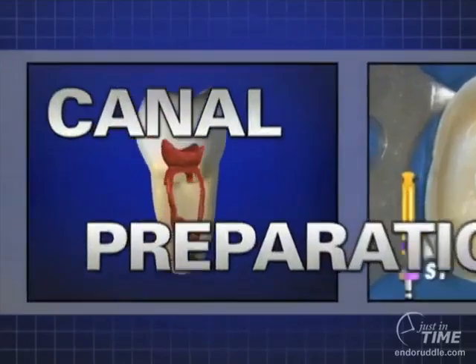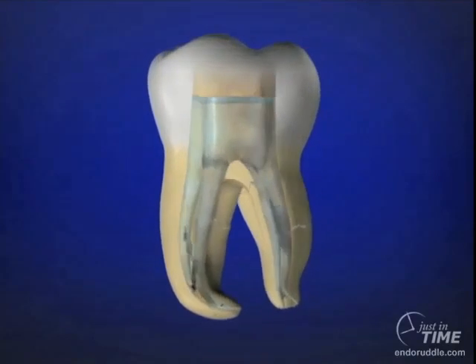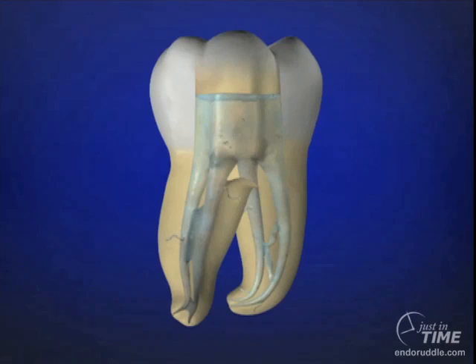But when you think about the micro CT work that we see in various textbooks and online around the world, some of these systems are very complicated and formidable. Our job is always the same, a complete access. And then, of course, we have to catheterize the canal and create a smooth, reproducible glide path. So all my discussions about shaping are limited by the assumption that you have a glide path. And we talked about previously the instances where you have a reproducible glide path versus when you have an irregular glide path. And those have different management schemes.